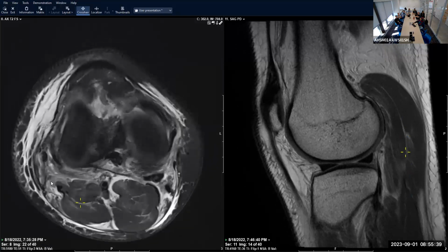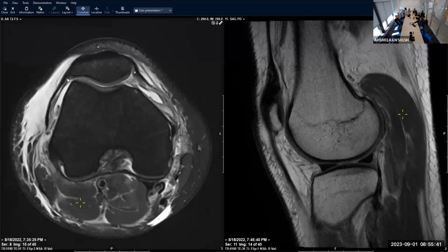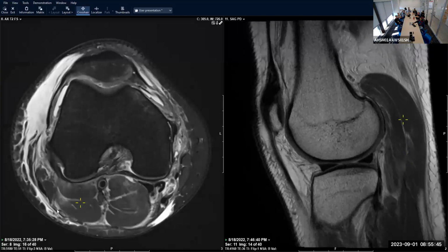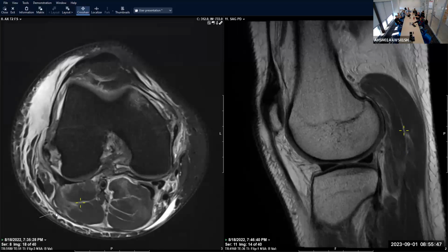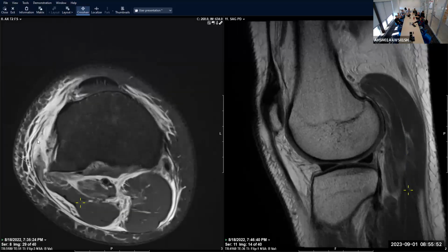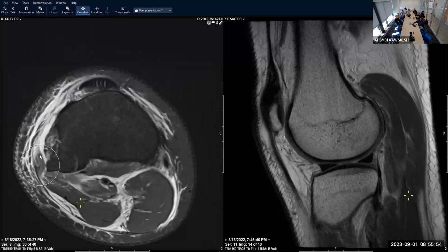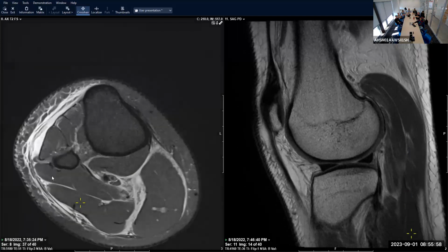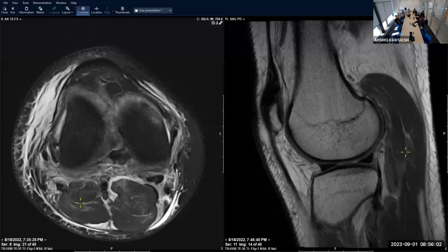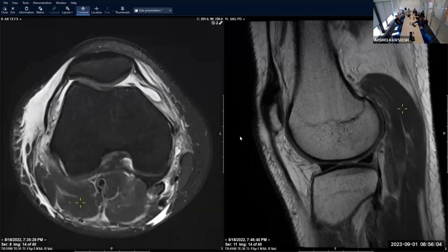There's a little defect in our lateral patellofemoral retinaculum, positive arrow sign through here. But look at this peroneal nerve. Here it is. It's coursing anteriorly, and then here it's very thick, edematous, and taking these abnormal contours. So I wouldn't be surprised if they had some degree of neuropathy resulting from this injury.